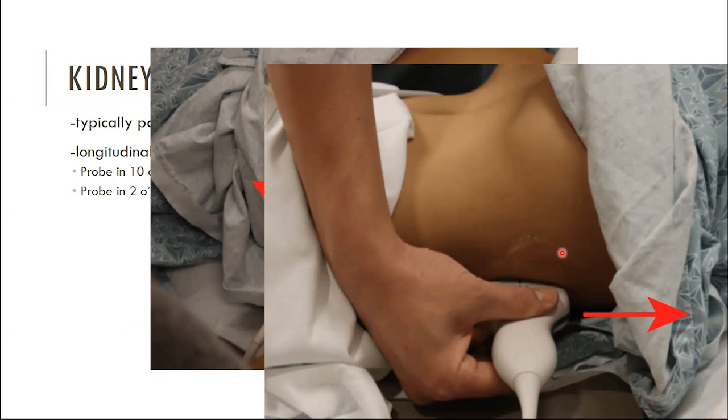What you'll see in your formal kidney ultrasounds, they'll give you a kidney size and they'll give you a length. And with practice and time, you'll realize that's their best guess. That was the best view they could get. Your good technicians can be very consistent and very accurate. Less good technicians, you could have wide variation in what that kidney size is. So just be cognizant of that as well when you're reading your formal kidney ultrasounds. What they're doing is they're just scanning to try to get the maximal length view, and that is what has determined the kidney length.